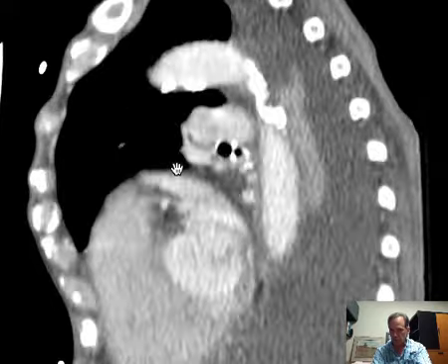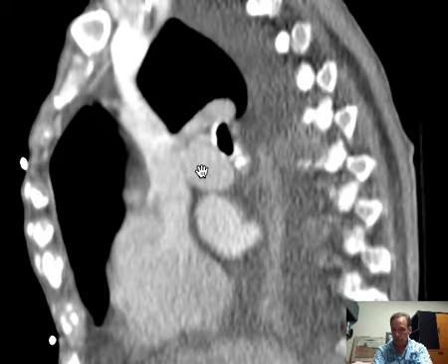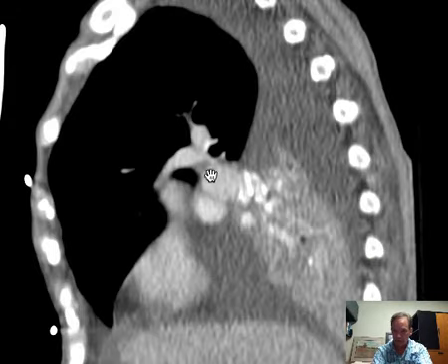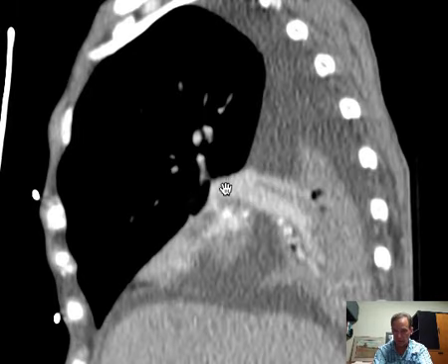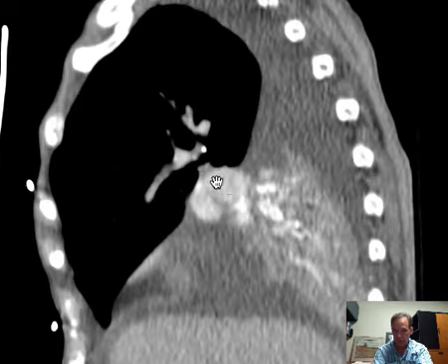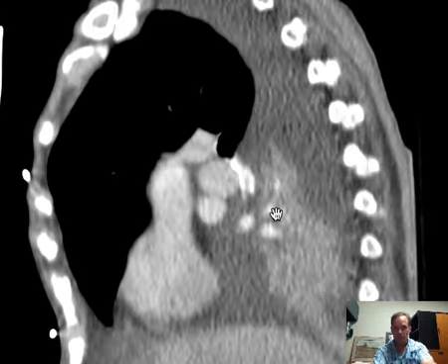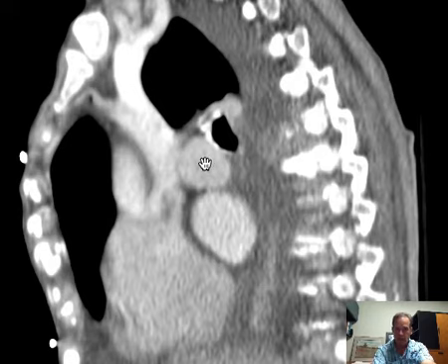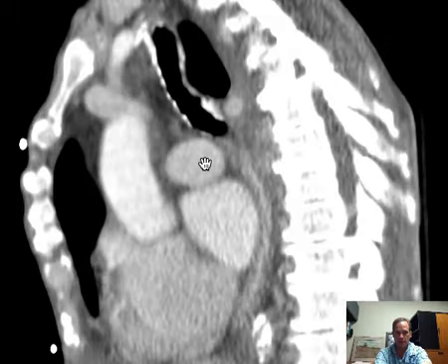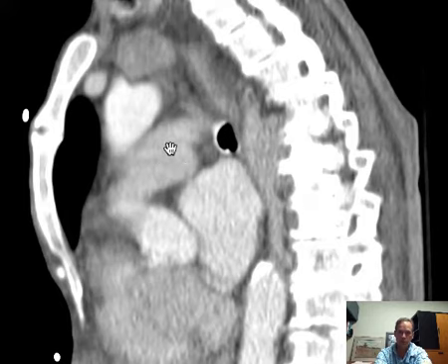Or it's not under that kind of pressure. So let's take a look. So here is the right main pulmonary artery branching and going off into the right lung. And here you can see a branch from it. There it is branching. We go back. We follow it back to the midline, and we see this is the right main pulmonary artery, and at a point we will find ourselves in the midline, which is where the distal main pulmonary artery is.